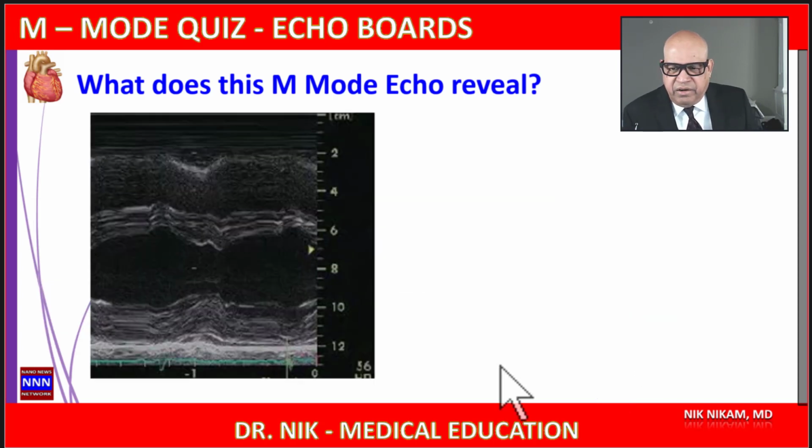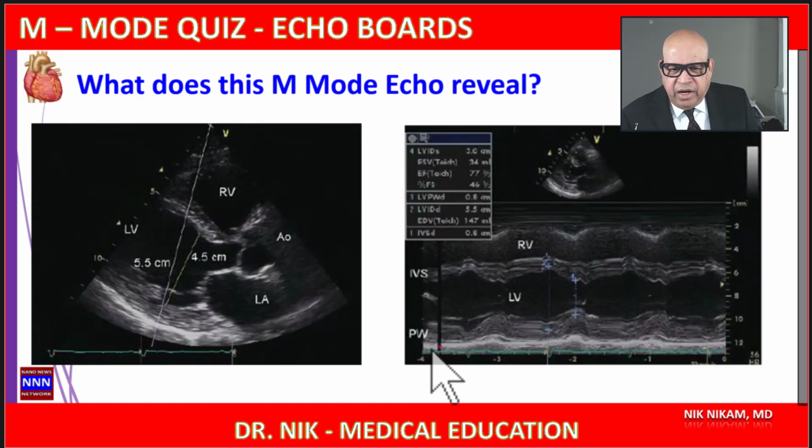All right, here's an example. What do you see? Name all the structures that you see and let me know if you see any abnormality here. There are a lot of interesting physiological points that we can bring out in this particular tracing. All right, let's proceed. And here is a similar image. First, I want to point out there is a very good delineation of the septal borders, which is beautiful. And here we have the electrocardiogram, and here's the QRS complex, here's the QRS complex.